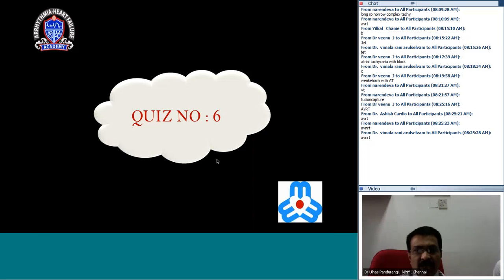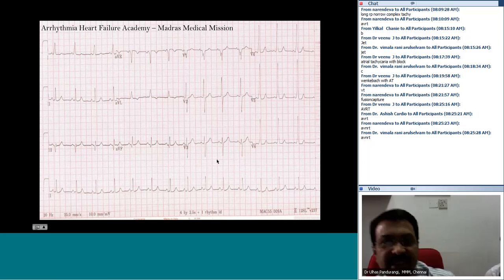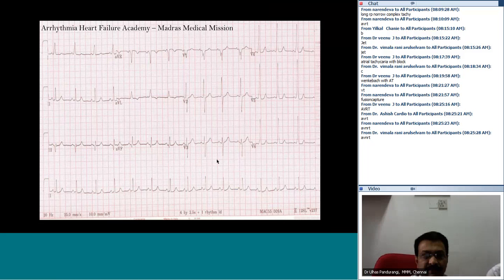Let's now look at some other ECGs belonging to babies. I bring your attention to the rhythm of this ECG, which is sinus rhythm, because you have got typically nicely looking P waves preceding the QRS complexes. Go through carefully, you will notice that at times the PR interval, especially in some leads, is very, very short. Look more carefully, you start seeing the delta waves. So essentially, it seems to be short PR during sinus rhythm with delta waves.